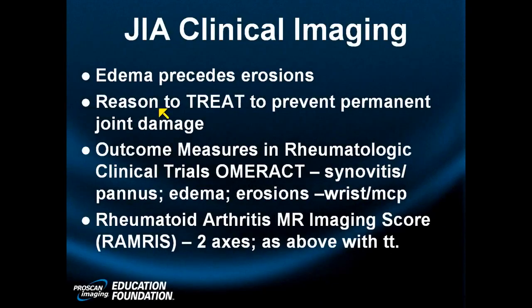On MR, edema always precedes erosions. MR is the earliest detector of an inflammatory arthritis, bar none, including nuclear scintigraphy. And we want to get them early. There's no radiation, so this is a test that has come into its own. It should replace scintigraphy for evaluation. It should absolutely be done in lieu of conventional radiography for early detection.